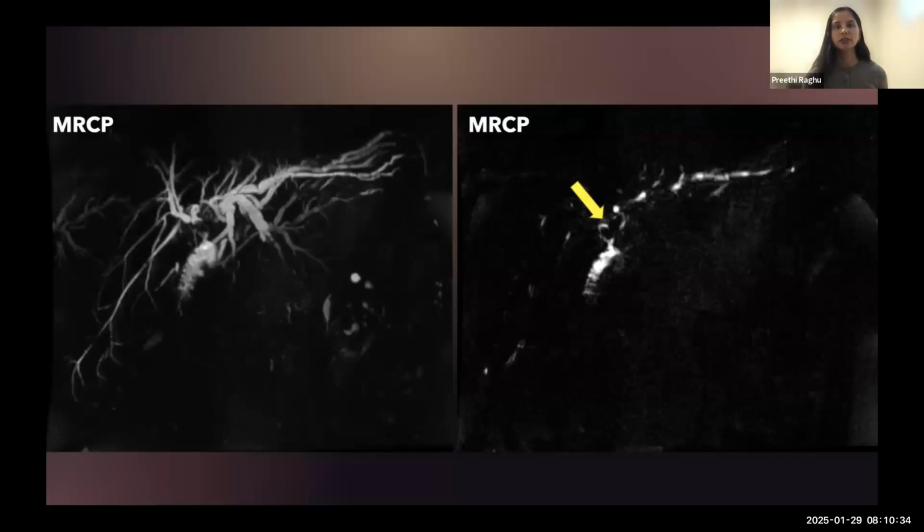And in the setting of liver transplant, we're already extremely worried when we see dilated ducts. Our first thing is to make sure the vasculature, in particular, the hepatic artery, looks okay, so that there's not any concern about things like biliary necrosis. I'm not showing those images, but all the transplant vasculature in this patient, including hepatic artery, looked totally normal. But we did see this diffuse dilation of all the intrahepatic ducts in this patient.